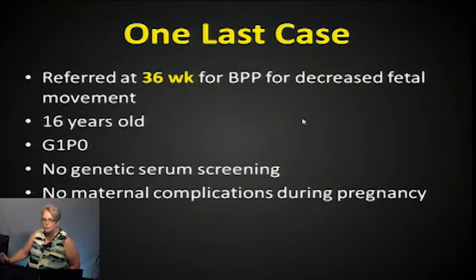This is just to remind you that even though you're not doing an anatomy study, even if you're just doing a biophysical profile, always look at the head, heart, and kidneys, because those are the things that continue to develop and end up having problems later on. So even as you're just doing your biophysical, just make sure you kind of look at them. Make sure there hasn't been any big changes.